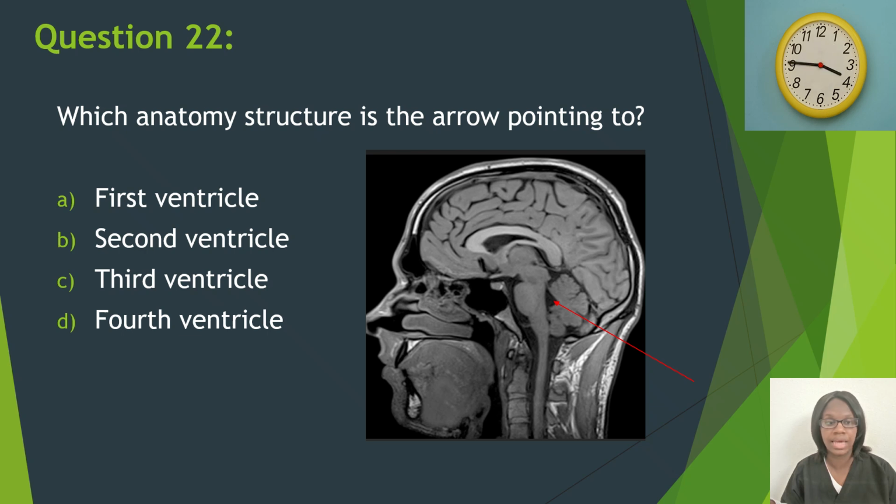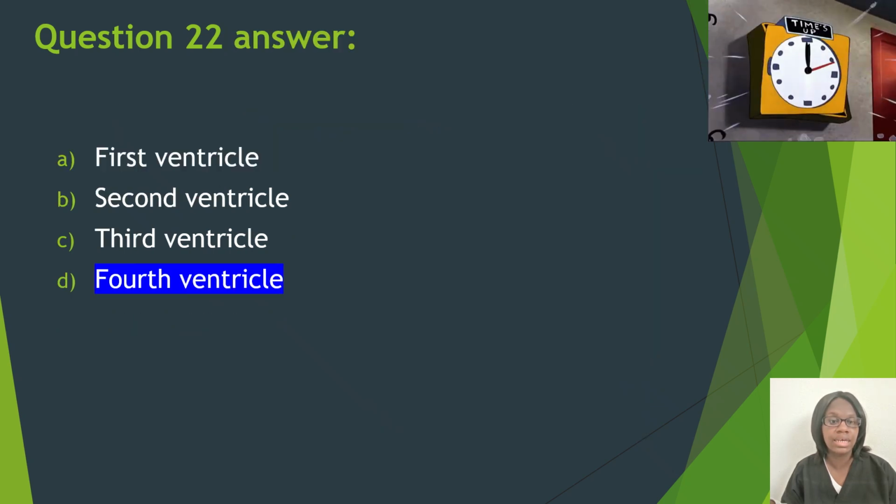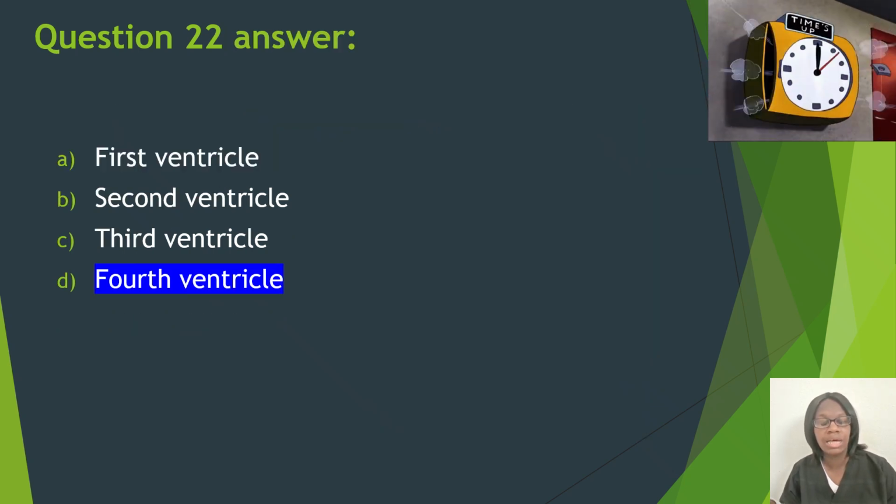All right, the correct answer is D, fourth ventricle.